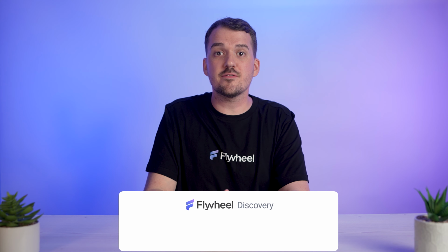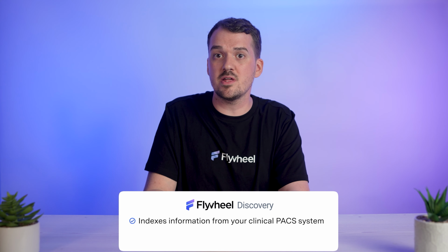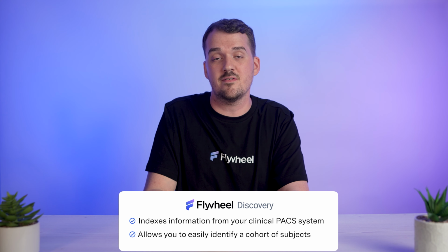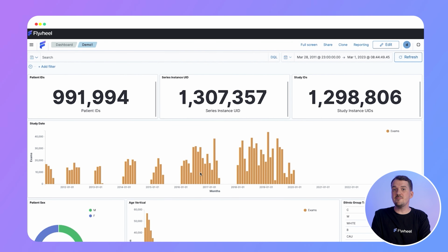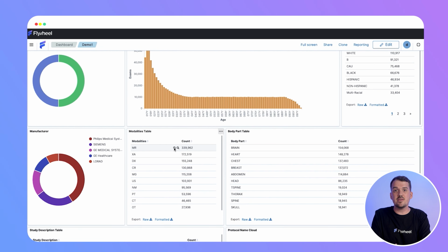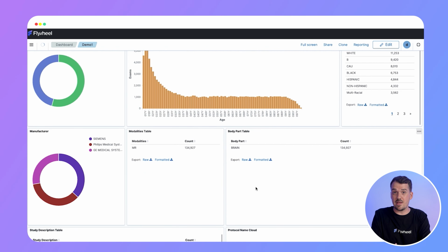To start, we will go to Flywheel Discovery. Flywheel Discovery indexes information from your clinical PACS system that allows you to easily identify a cohort of subjects. There are many filters we can customize according to the metadata we have about our data. Here, we will filter by MRI images of different regions. We will choose the brain.